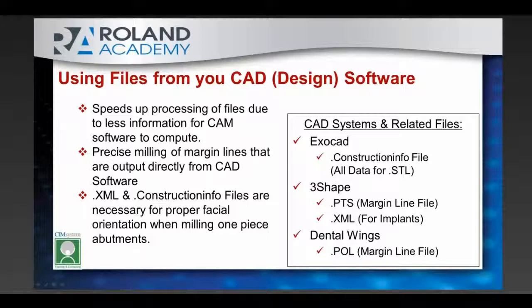Now, by default, most CAM softwares out there, as well as the SUM3D software, will automatically detect the margin as best as it can. Now, as many of you lab owners know, and some of you in production know, that may not always be the best detection, and primarily because when the dentist goes to prep inside the patient's mouth, he may come out with a jagged margin, and as such, when you design a restoration around a jagged margin, you're going to end up with jagged lines along the margin on that restoration. So because of that, it's a lot harder for the software to detect it. It also takes up a little bit more extra time because the software has to try and detect those. So what this does, if we use these additional files from the CAD software, it automatically tells us where you designed the margin, and it takes all the legwork out of there, so the CAM software doesn't have to automatically detect it.